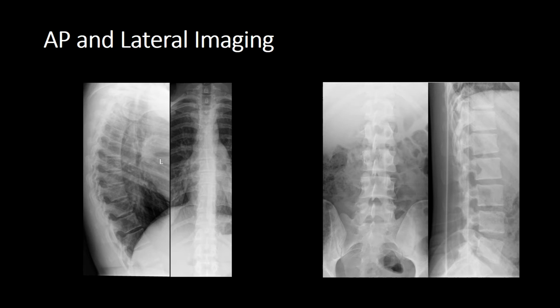This is, again, as I can say, nice. We can actually see some of the spinous processes. You don't always get the ability to see the spinous processes on a thoracic spine. Now, I appreciate it's quite difficult to appreciate on this view, but what you're looking for is a gentle posterior concavity to the posterior borders. We'll look at that in more detail. And then also, don't forget to check the soft tissues and any of the ribs.